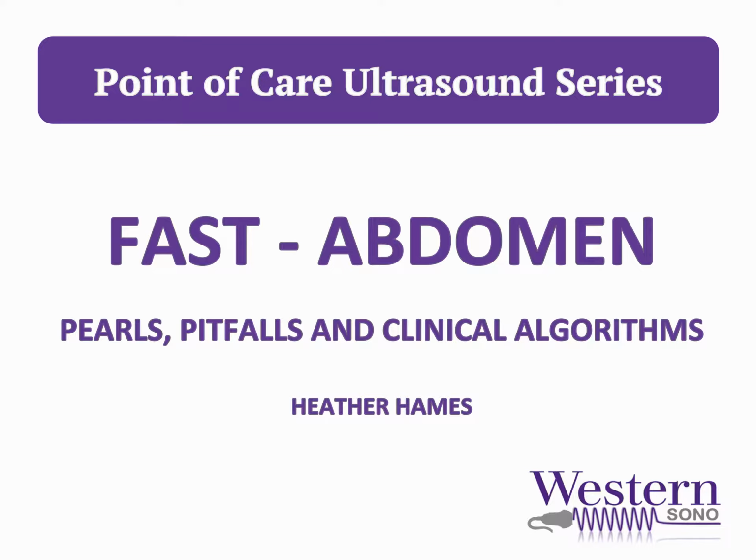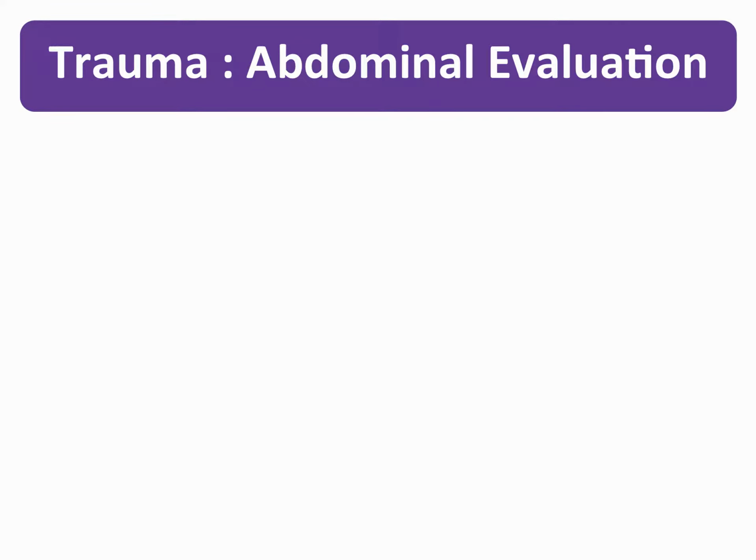In this screencast, we are once again going to focus on the abdominal component of the FAST exam. The previous screencast in this series reviewed scanning technique, image interpretation, and proper archiving of your studies. If you haven't watched it, be sure to check it out. This time, we will focus on the clinical applications of the FAST exam, highlighting some important pearls to know and pitfalls to avoid in your real-time bedside interpretation of this important exam. So let's jump right in.